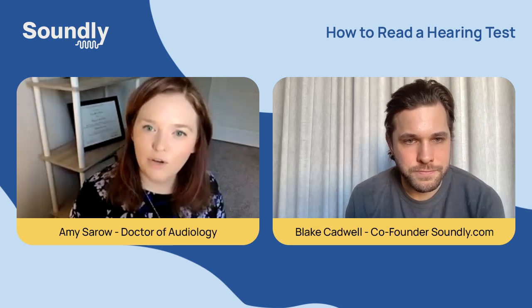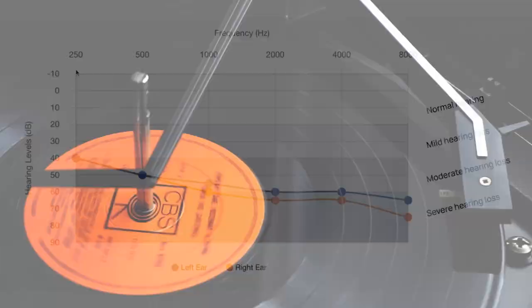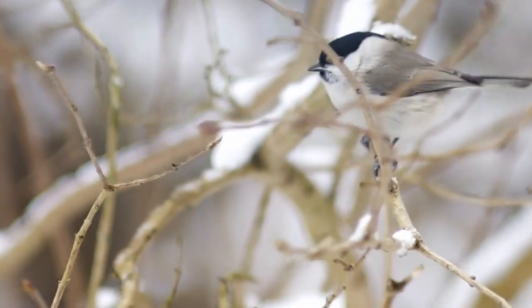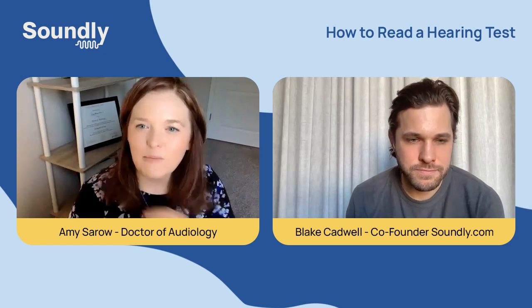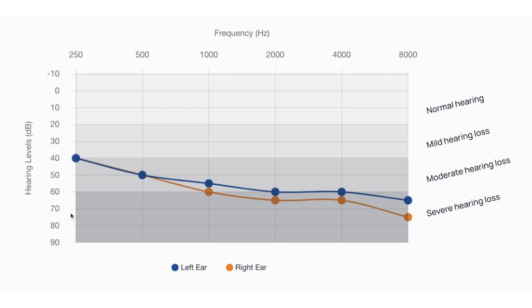If we look at an audiogram, at the top left corner where we start up the frequencies, that's going to be low frequencies over to the left. And as we move over to the right side, that will be higher frequencies. So low frequency, think tuba or Barry White. And then high frequency, think birds or flutes, those high-pitched sounds on that side. Then if we go down the side of the graph, we're going to have really soft sounds at the top. And then as we move progressively further down, it'll be louder and louder sounds.